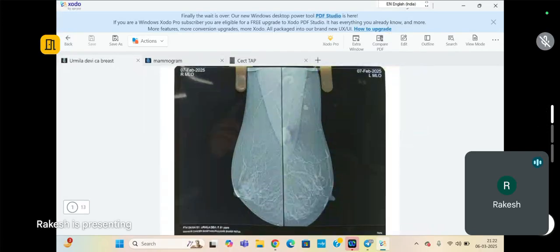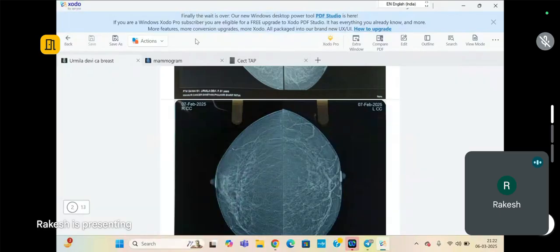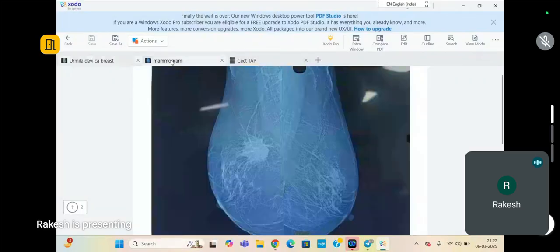That location was not very good to take the memo, so I took another one. This one. Okay, fine. So you'll do mammography as the first imaging, right?